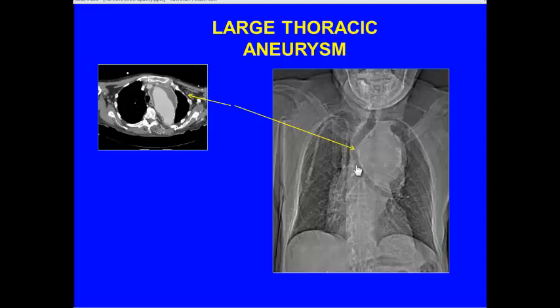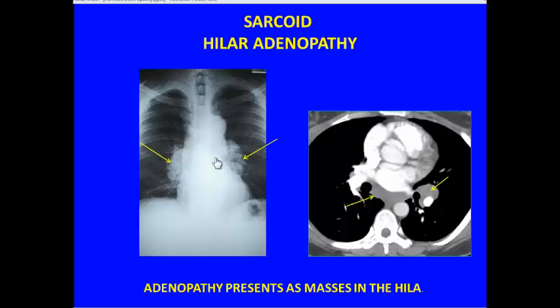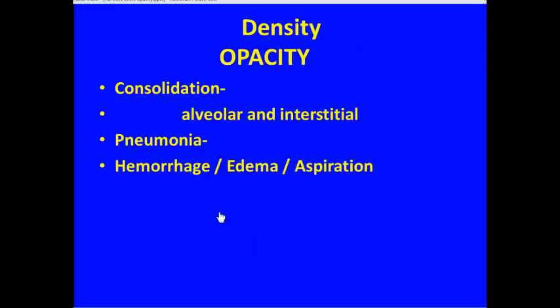Again, here, a big mass or some sort of mass effect. Look how that trachea is bowed. We know the aorta is right there, so that location can help us out a lot. Bilaterally, we're seeing here in both hilum, so we'd think more or less about adenopathy, some sort of process that might enlarge the lymph nodes. So those locations can help us a lot too.